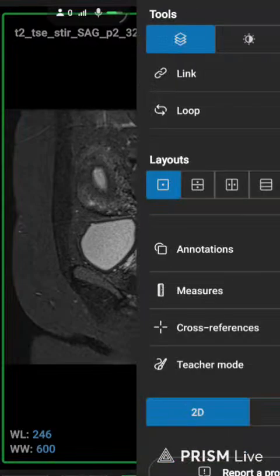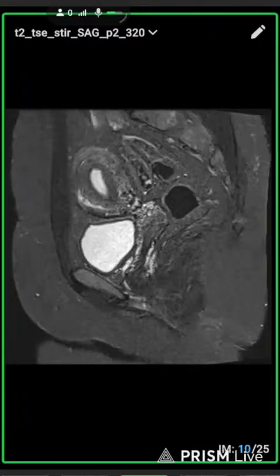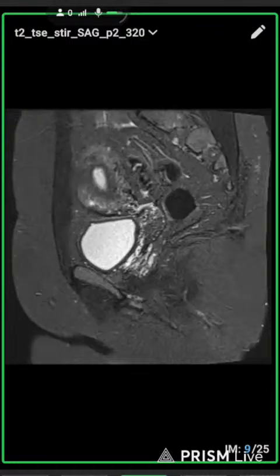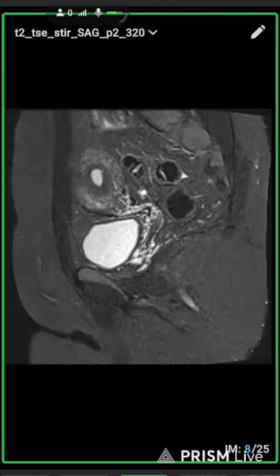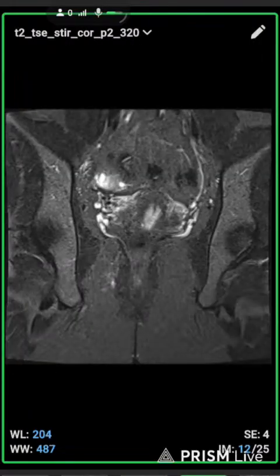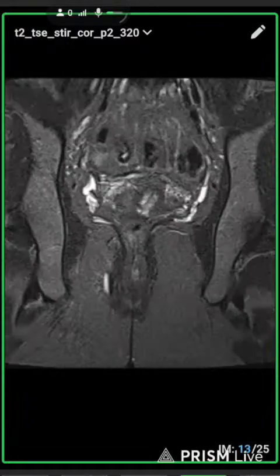When I am scrolling the image, this is the fistula, but most patients don't have such a big fistula. This is a larger fistula, so it's totally identified in this MRI image, but most patients don't have such a large area.